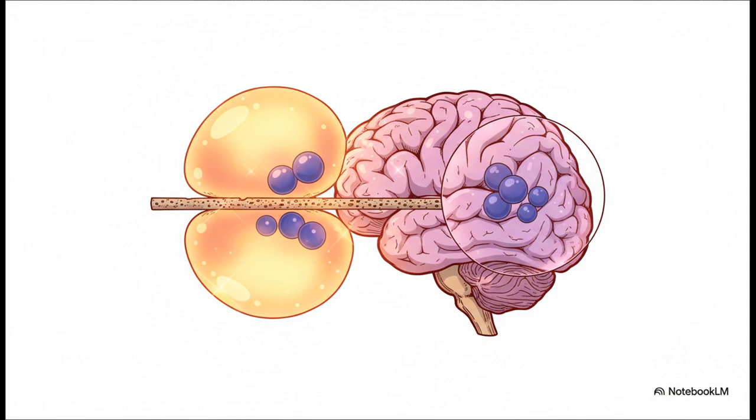It comes from the olfactory cells way up high in the nasal vault, right at the cribriform plate. And it does this classic thing where it grows up into the brain and down into the sinuses, creating that perfect dumbbell shape with a tight little waist where it squeezes through the bone. Oh, and here's a little pro tip. Look for cysts inside the part of the tumor that's in the brain. That is a massive clue.